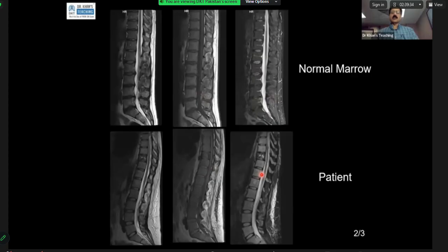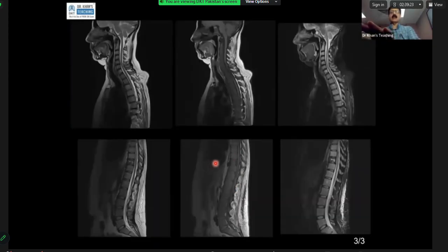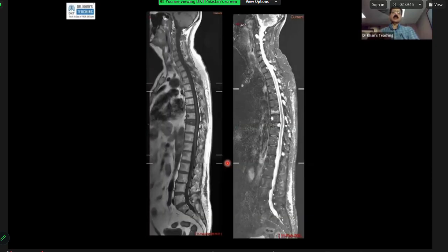It can be infection. This was a case of multiple myeloma. It can also be a case of diffuse metastasis because everything is abnormal. Whole of the spine is abnormal. And it can also be in other parts of MSK, you will get similar findings. So this is another case of whole spine where you can see metastasis. And for example, just concentrate on this one. This one is low on T1 and bright on the stir sequence.